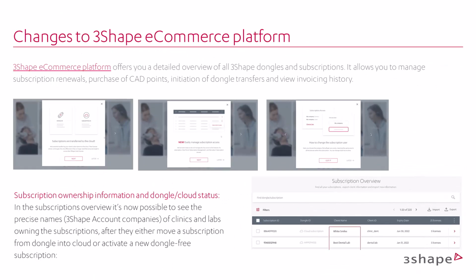3Shape e-commerce platform provides a comprehensive overview of all 3Shape dongles and subscriptions. It enables you to manage subscription renewals, purchase CAD points, initiate dongle transfers, and view invoicing history.